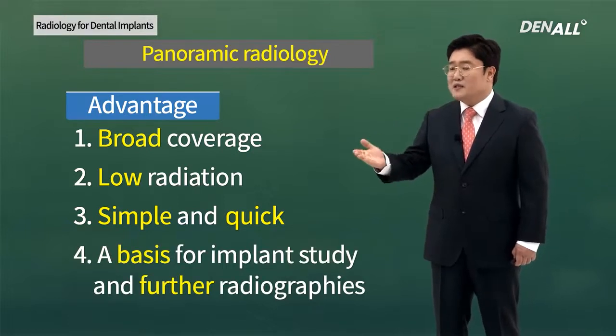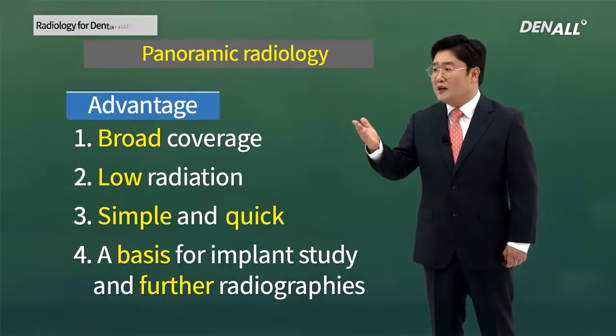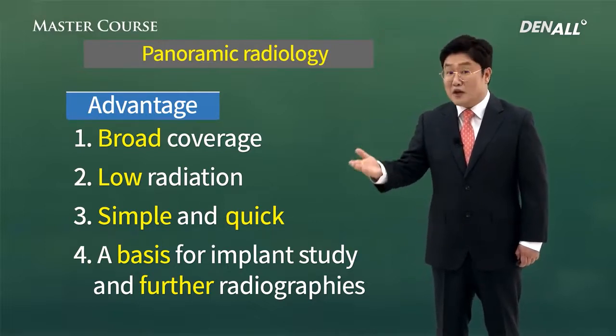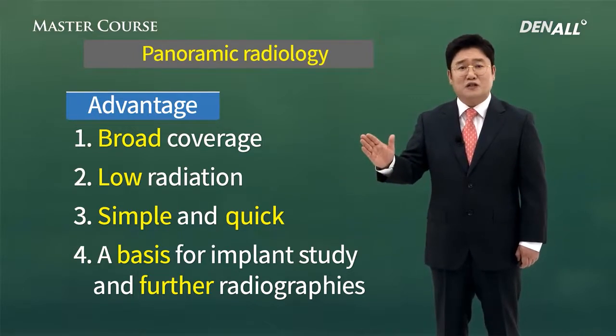Panorama radiology is the basis for implant study. Once you take panorama pictures, further procedures, further images, further radiographs can be decided. So this is the basic information, very important information.